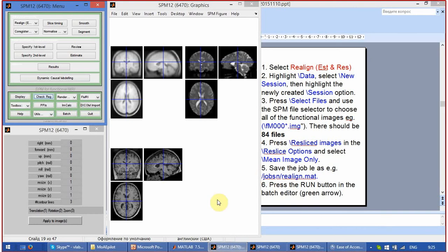At the moment, as you can clearly see, they are not parallel, but we can reslice them if we need. It helps a bit to coregistration, but it is going to reduce a bit the quality of your data.